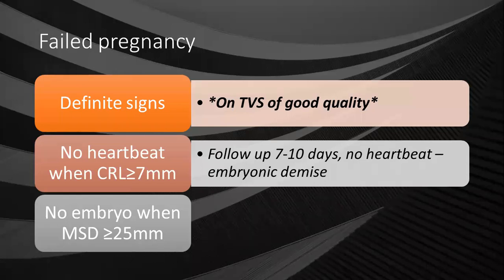We are not sure, because remember, this is a cutoff point. There are some fetuses where, if you don't see the heartbeat at 5 millimeters, actually, literature says whenever you see an embryo, you're supposed to see the heartbeat. So when we see our embryo at approximately 5 millimeters and we don't see a heartbeat, maybe this is a definite embryonic demise, but we are not yet at our cutoff value.